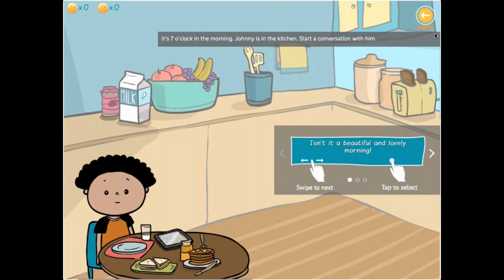There is a scenario here that says it's 7 o'clock in the morning. Johnny is in the kitchen, start a conversation with him, and there are three options for me to choose from. Isn't it a beautiful and lovely morning? Good morning, Johnny. And hi, Johnny, I was wondering if you slept well last night.